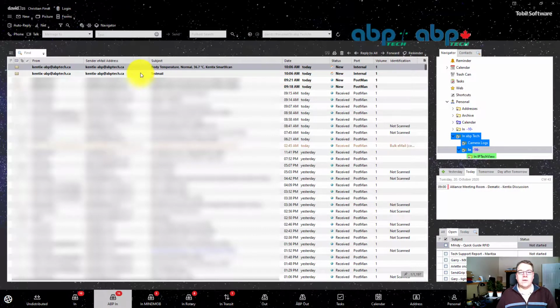So as you can see, we have both emails, the test email and the email for the body temperature scan. That's how easy it is for setting up a user with RFID tag identification, as well as getting notifications for scans or only raised body temperature scans.